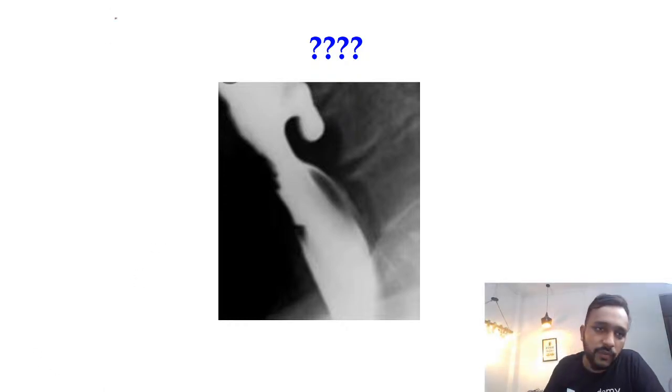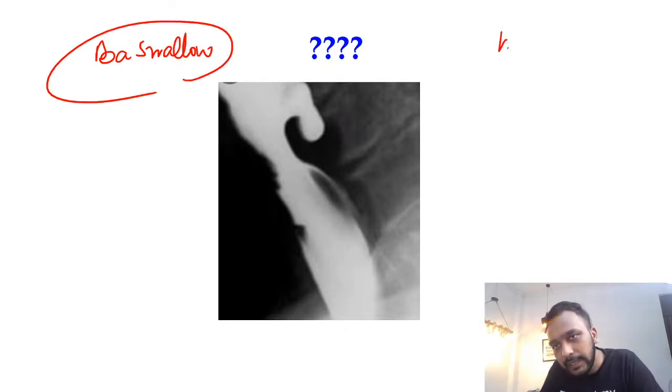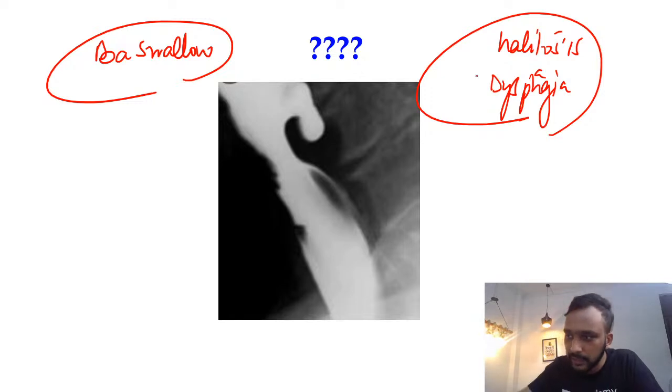Okay, next barium swallow image. Guys, what are you able to see? A patient presented with halitosis, regurgitation of food and dysphagia. So what is your diagnosis for this case? Come on guys, what is your diagnosis for this case?